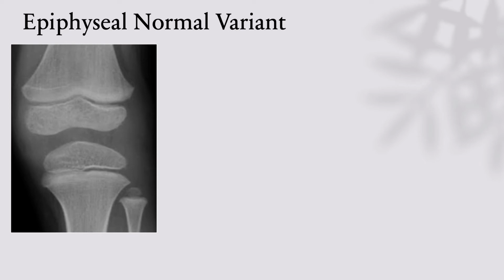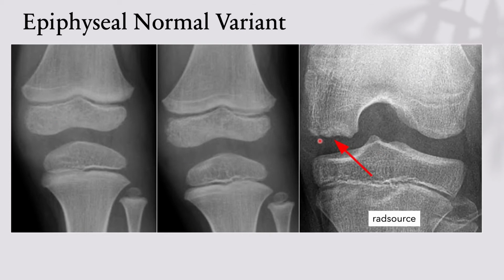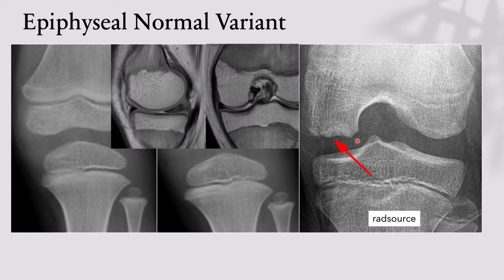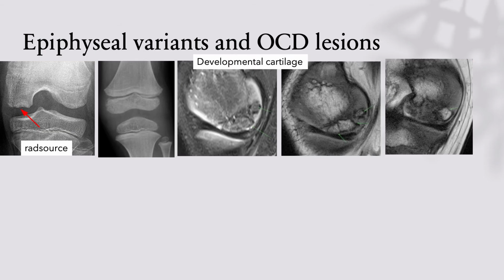Moving on to the epiphyses, where normal epiphyses are fairly smooth. You can occasionally see irregularity of the epiphyses, which is a normal variant. It may be fairly gross, where you end up seeing flattening, and this is just because of the way the secondary ossification center ossifies. And in this situation, here is the normal femoral epiphysis, but in this normal variant appearance, you can see a rather fragmented appearance to this epiphysis on the sagittal and coronal images. And this is nothing but a normal variant.